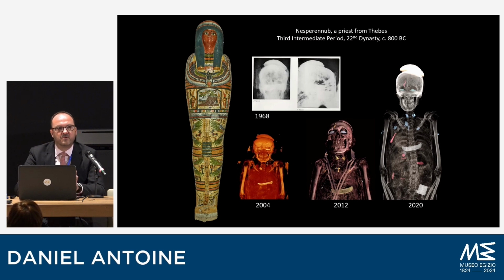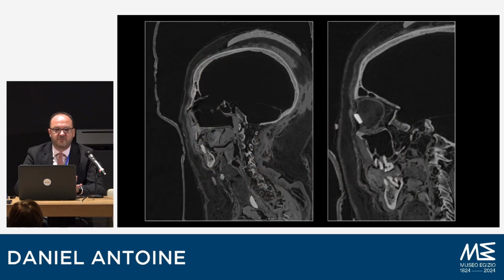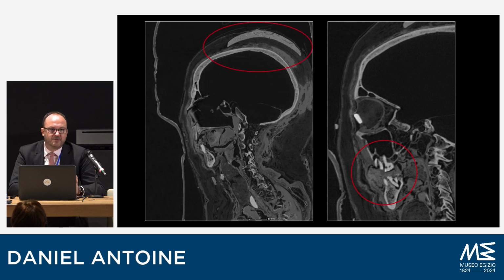And every time we're seeing more details, we're revealing more amulets. Some of the things, for example, that we discovered originally in Mummy: The Inside Story, they talked about one dental abscess. We actually have 18. And the unusual bowl that was being placed on top of his head, which nobody has a good explanation for, originally was thought to be stuck on as an accident of the embalming. You can see actually it's been carefully placed by the embalmers within layers of bandages. So it's been deliberately placed.